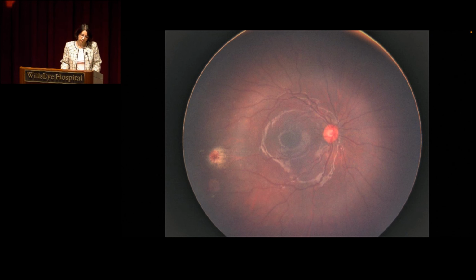Of course. So we have a color fundus photo, sounds like maybe an EUA photo of the right eye. The media appears clear. The optic disc has a very distinct clear margin appearance to it, an ample rim here. The retinal vasculature, which we're mostly seeing in the posterior pole, seems to have a normal course and caliber, maybe a little bit tortuous, but not too bad as far as the extent that we can see here.